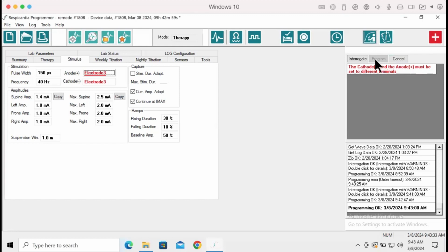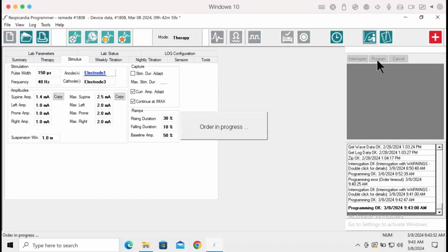An error message will be displayed in the programming window message field indicating which parameters are conflicted and the reason for the conflict. Once the parameter conflict has been resolved, the program button will be activated and you will be able to set the new parameter setting.